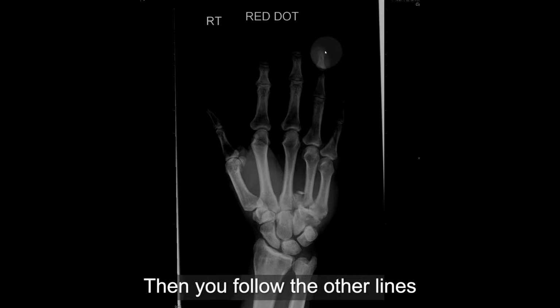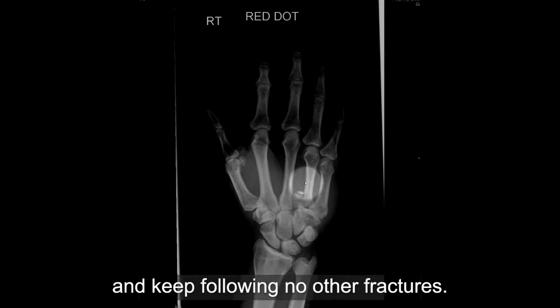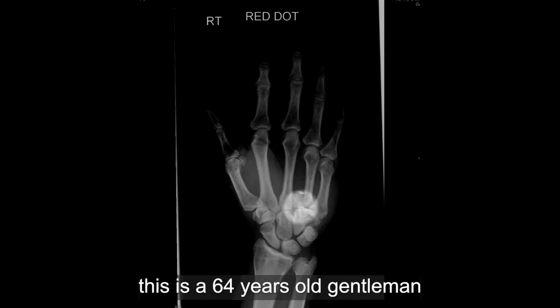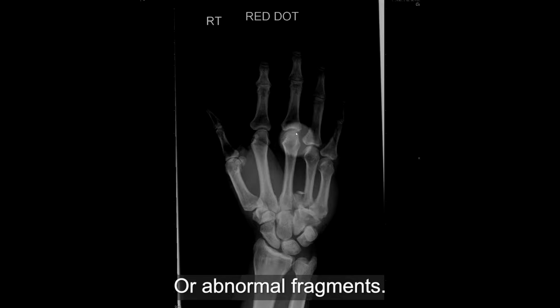Then you follow the other lines and we can't see any fractures. You keep following, no other fractures. You may see some irregularity here, but don't forget this is a 64 year old gentleman and he could have some degenerative change, but there's no fracture or step like this one or abnormal fragments.